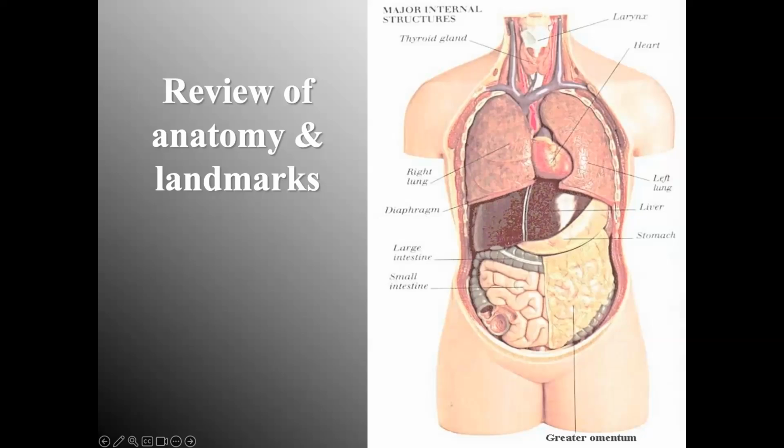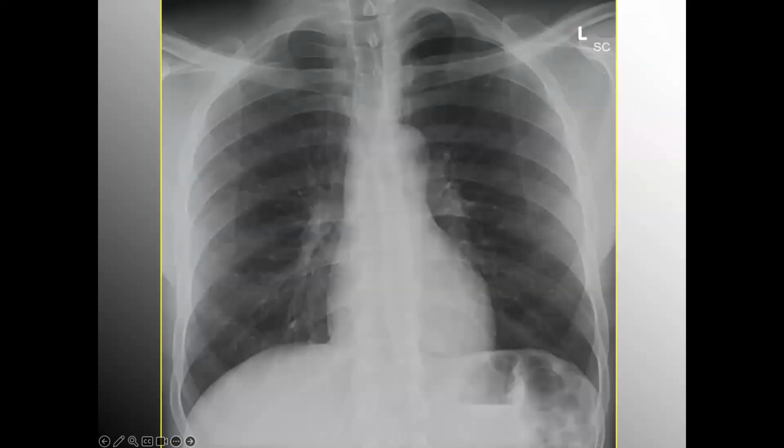Yes, anatomical landmarks are important, but also each major soft tissue structure, such as organs and their normal arrangement, must be front of mind. That way, as you scan over a 2D X-ray, you're seeing in your mind's eye the underlying soft tissue structures, and that is what allows us to form a clinical assessment from a single image, right? Again, what is shown here, just for perspective, we're building up here, is most likely what is known as an AP chest X-ray, an anterior posterior.